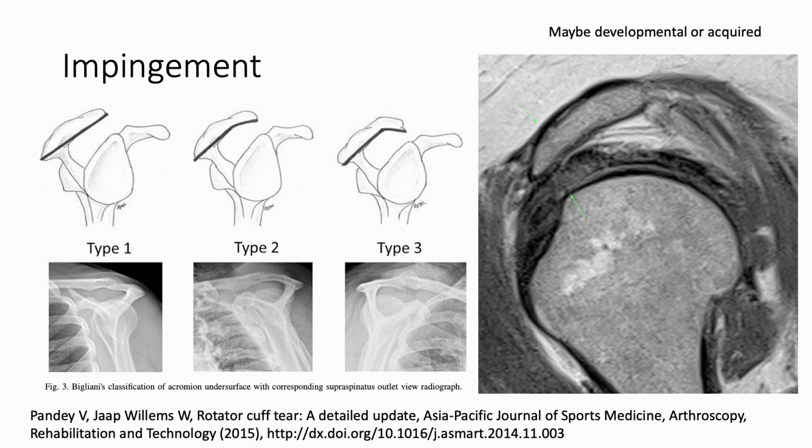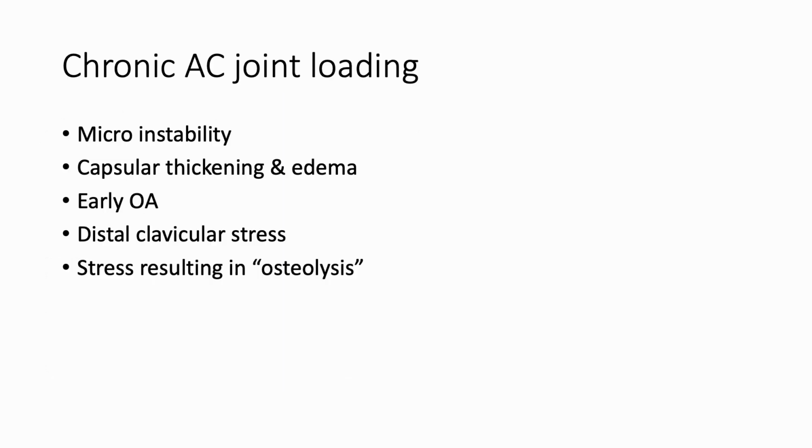Another thing that people talk about commonly is looking at extrinsic impingement upon the shoulder by abnormal positions of the acromion, so abnormal acromial tilt. I'm not a big believer in this. Sometimes I see large hooks, but oftentimes you see people with hooks and all sorts of other things that don't actually have any impingement. So the clinical correlation between the presence or absence of a hook and the presence or absence of impingement is very poor. So I don't normally go into this type 1, type 2, type 3 descriptions or go into these things.